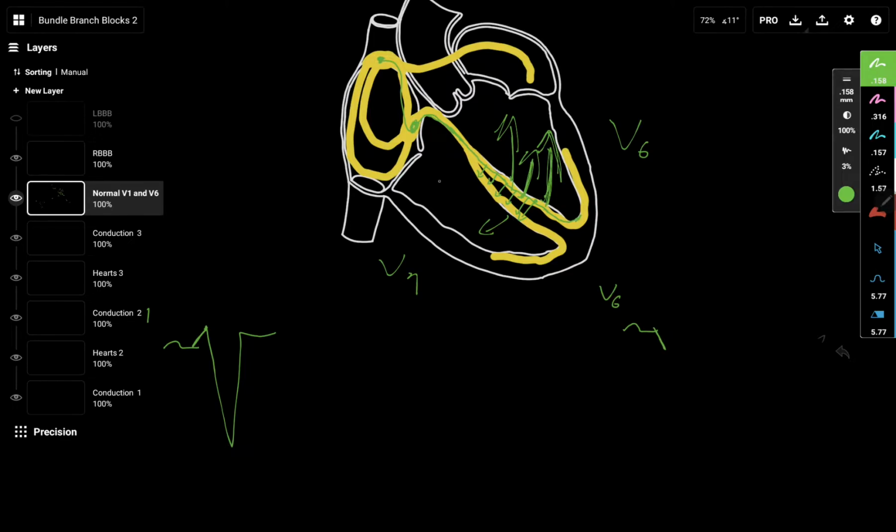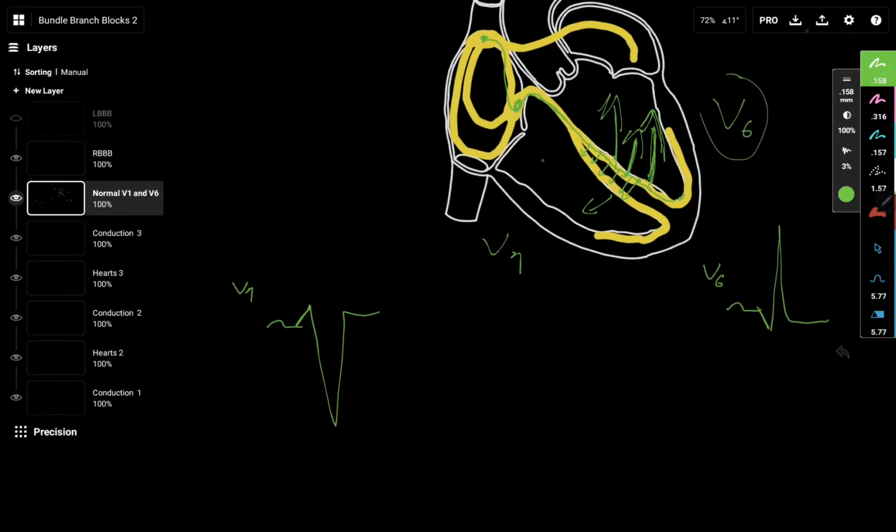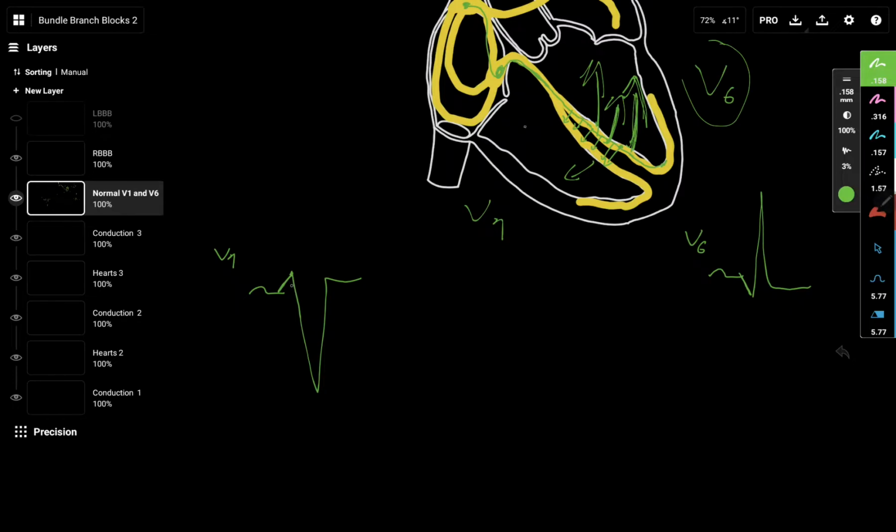And then what happens? Both ventricles depolarize at the same time, but my ECG will pick up primarily the depolarization of my left ventricle, therefore a big depolarization towards V6. Yes, you can see the arrows traveling towards V6. That's why on my lateral view of my heart, right? You can probably see that in lead 1 as well. In this depolarization, you will have quite a big positive deflection there. Now, admittedly, in V1, it came out a little broad.